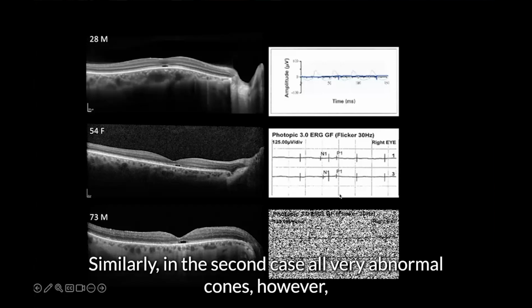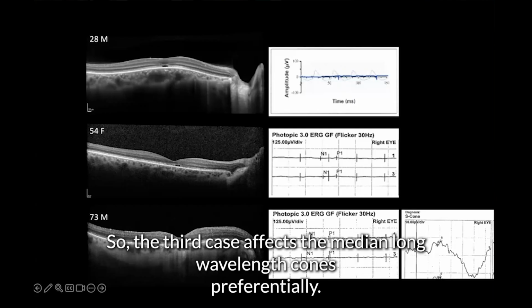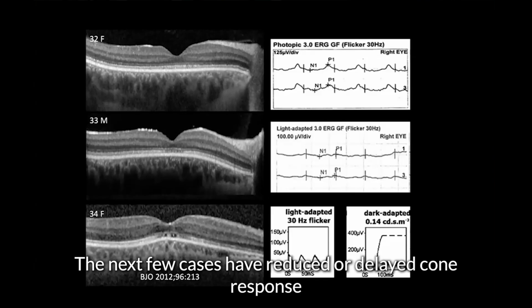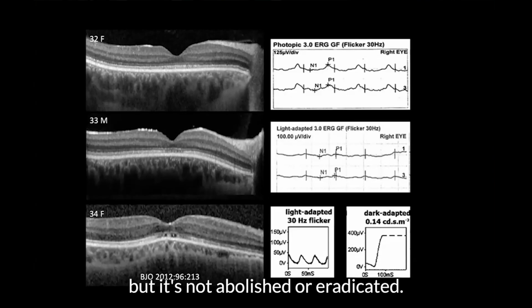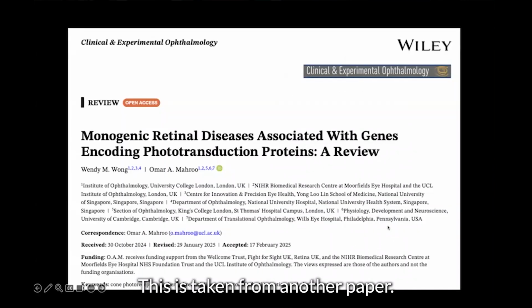Similarly, in the second case, all very abnormal cones. However, the first 2 do not have an S-cone response, whereas the third one has an S-cone response. So the third case affects the medium and long wavelength cones preferentially. The next few cases have reduced or delayed cone response, but it's not abolished or eradicated. And in the third case, the dark adapted response was supranormal as well. It's taken from another paper.